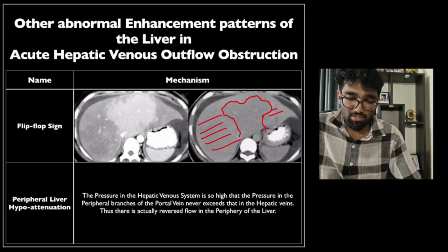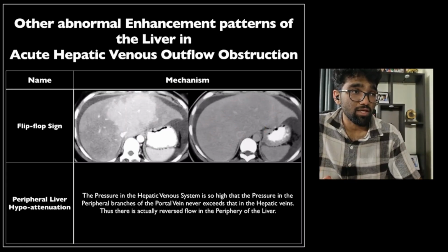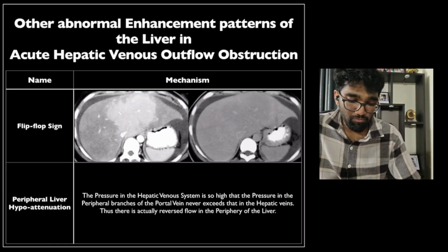Okay, so this is a flip-flop. Initially the center was hyperenhancing, then the periphery became hyperenhancing. So this is known as the flip-flop sign.